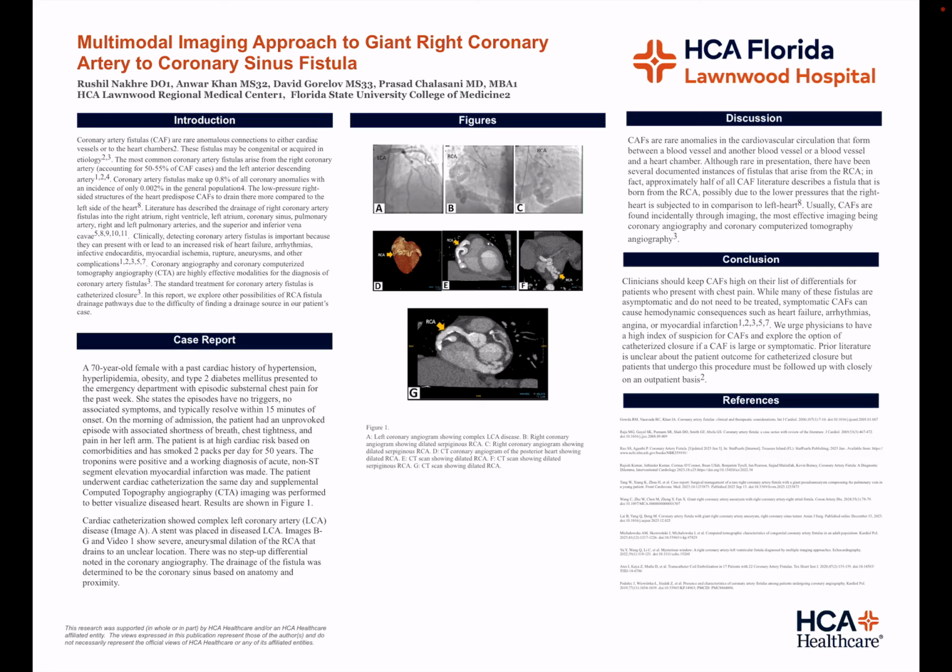The troponins were positive, and a working diagnosis of acute non-ST segment elevation myocardial infarction was made. The patient underwent cardiac catheterization the same day, and supplemental CTA imaging was performed to better visualize the diseased heart. The results are shown in Figure 1. Cardiac catheterization showed complex left coronary artery disease, image A. A stent was placed in the diseased LCA.